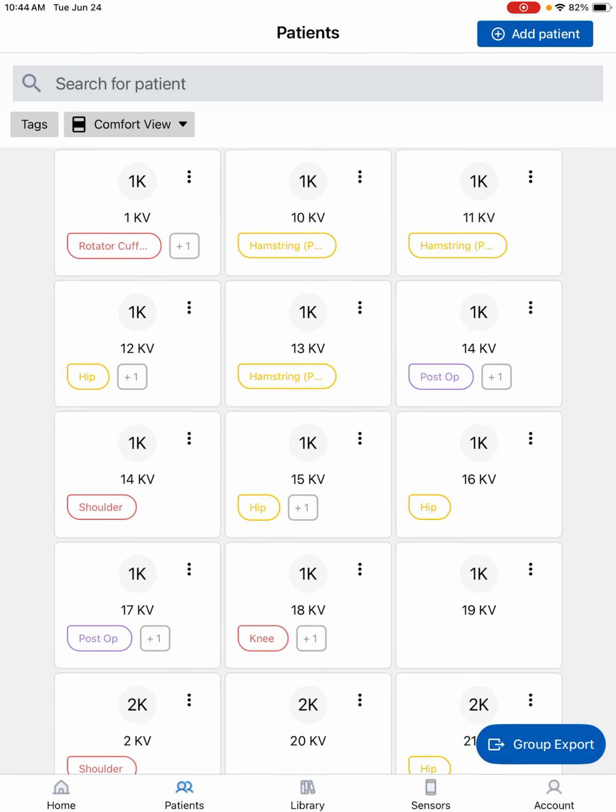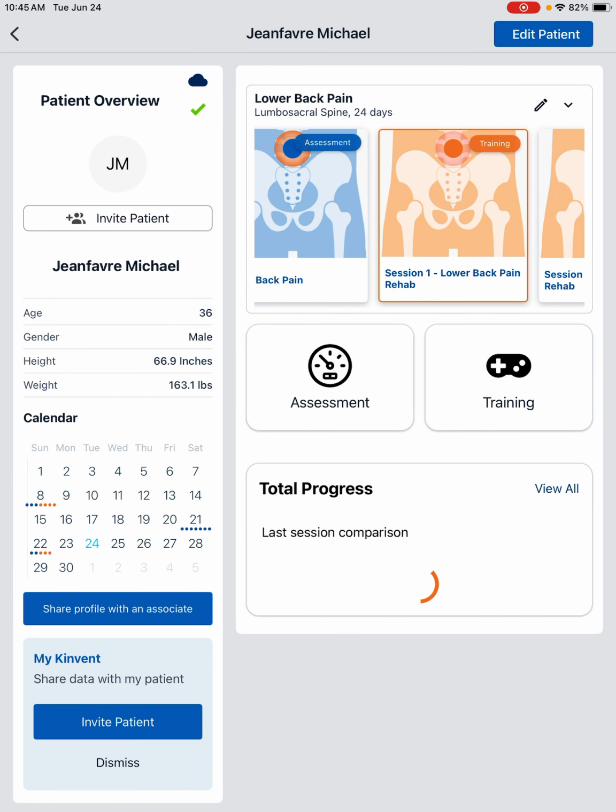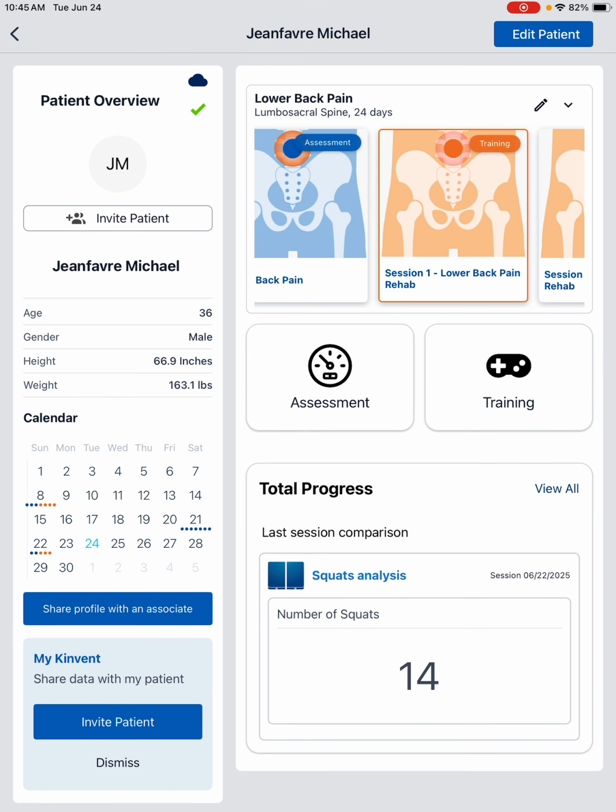So we are currently in an agreement with the ITS and the security team not to put in any patient information within the application itself. I will show you a couple of examples. So one option would be to create a profile for you as the provider and store all your patients under this. Just orienting you to what you see here.